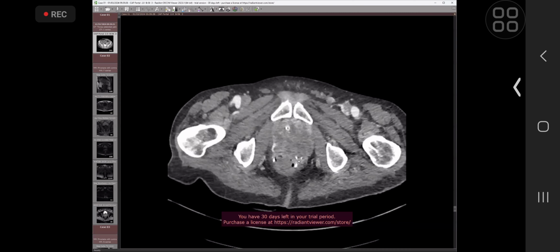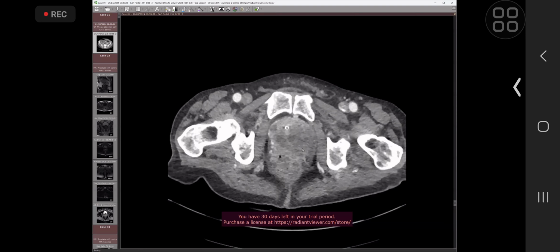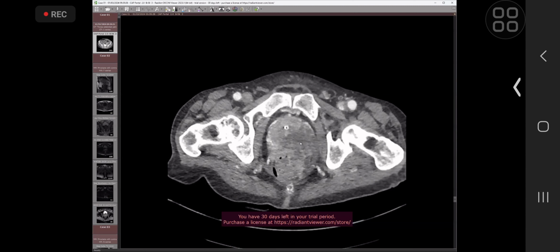So I think one of the first rules of radiology is that the larger a lesion is, the harder it is to work out its origin. If we trace this around, often if you point to the center of where a mass is, that's often quite circular, that can give you a clue as to where it originates from, because things tend to grow out like a ball. They don't always necessarily follow that pattern, but as a rule of thumb, that can give you an idea. So actually, if we look at this, the center is around here.